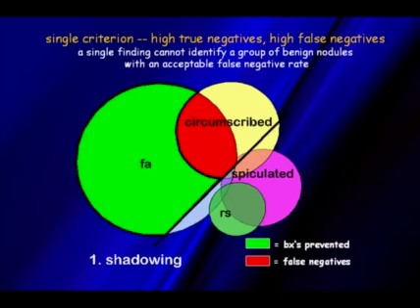And then we have things such as radial scars that present as spiculated lesions that we really won't talk about much today. Now, people sometimes think that we should not use ultrasound to try and differentiate benign versus malignant lesions. They say if you took a single finding, such as shadowing, you can see how many fibroadenomas we could prevent a biopsy in the area of green, but you could see how many false negatives that we would have in the area in red.